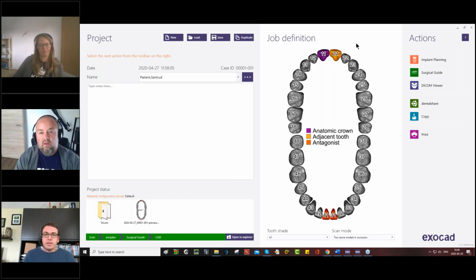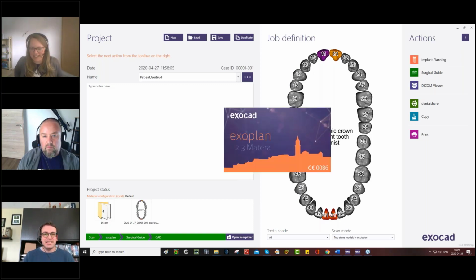Next question. Somebody asked, I think maybe they were a little confused about the density threshold step. How do you know where to place that? What should be marked blue and red? They asked if you can explain that step a little bit. I'll do my best. That's kind of challenging to determine. I'm going to start the implant planning software again and open that step. To be honest, it's not my favorite step. I don't use it, but I know Michelle, you like it.